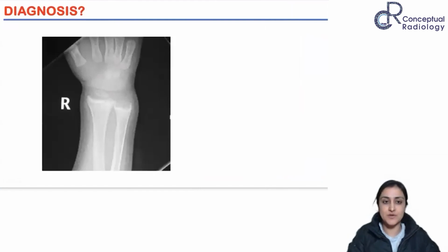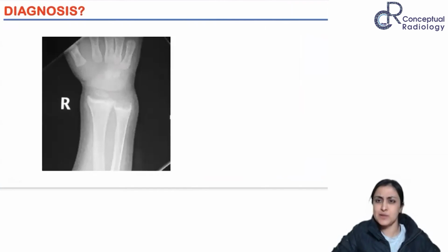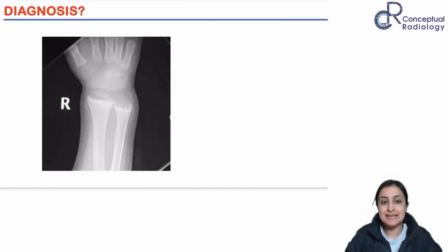Can you tell me the diagnosis here? Yeah, protuberant belly may be seen. I mean, not very important. What is the diagnosis here? Good. So this is indeed healing rickets.